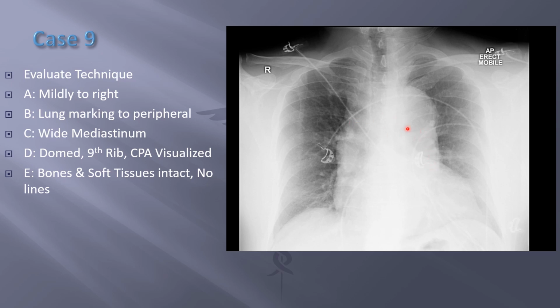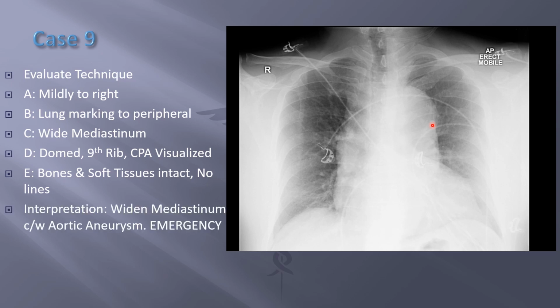But it's got a very wide mediastinum here. So the interpretation here is that this is consistent with an aortic aneurysm, and this is a medical emergency.